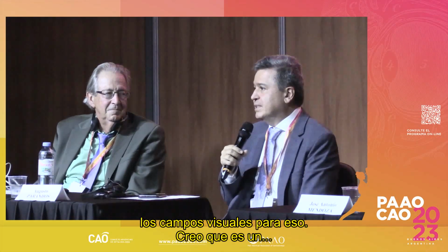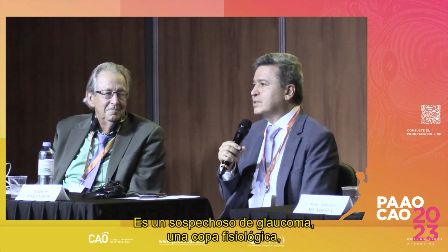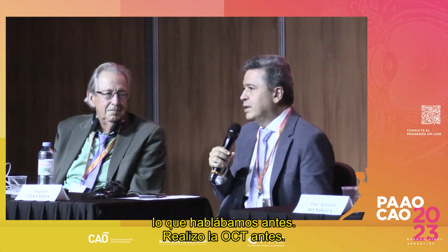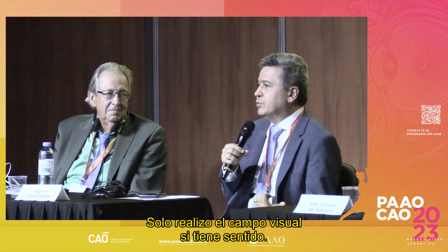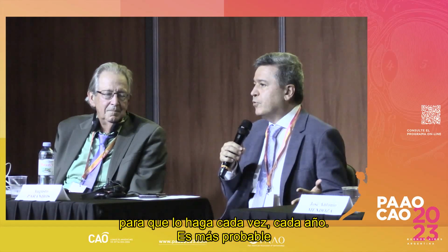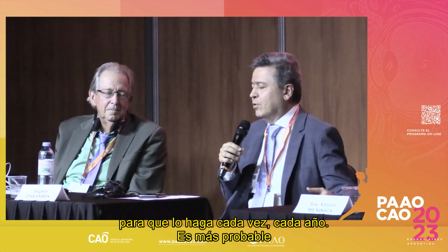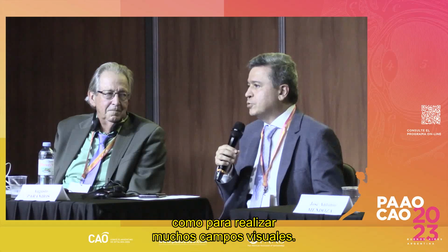I think that, but for some patients, for example, a glaucoma suspect, a physiological cup that we were talking about before, I performed the OCT before, and I only perform the visual field if it makes sense. Because I know that even if it's a glaucoma suspect, the visual field would be normal, and I think there's no reason for me to do a lot of visual fields every year for a glaucoma suspect that is more likely not to have glaucoma. I just follow them with the OCT.